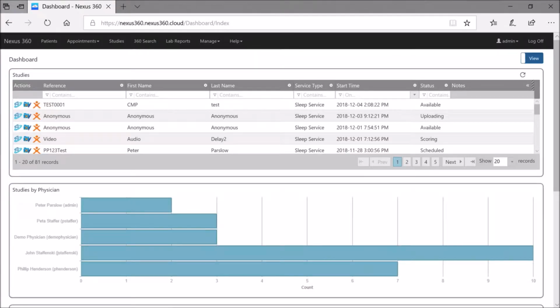So now, in terms of the permissions for reports, this is generally going to be something that will be set up by your lab manager. So you probably, as a regular user, will not have to worry about this so much. But one thing to point out is that you do need to have the correct permissions to be able to see them, edit them, delete them, etc.